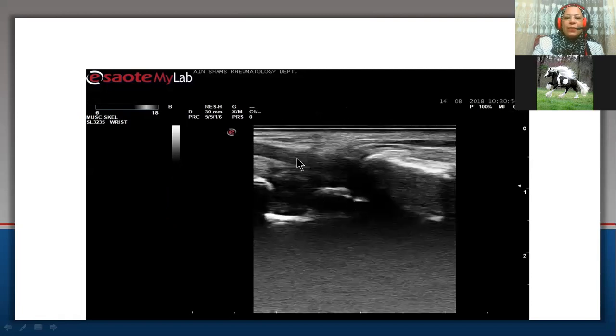Again, to confirm the picture, there is also abnormality, especially in the second metacarpal bone. On revising the history with the patient, she gave a history of previous fracture at the distal forearm and wrist, which may account for this distorted anatomy and abnormal shape or irregularity of the metacarpal bone, especially the second one, which may be fractured during the previous fracture together with malunion.